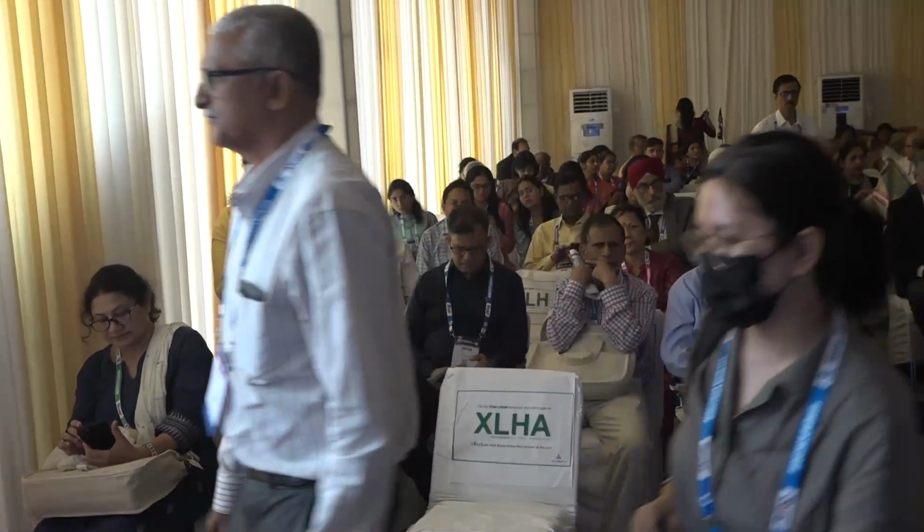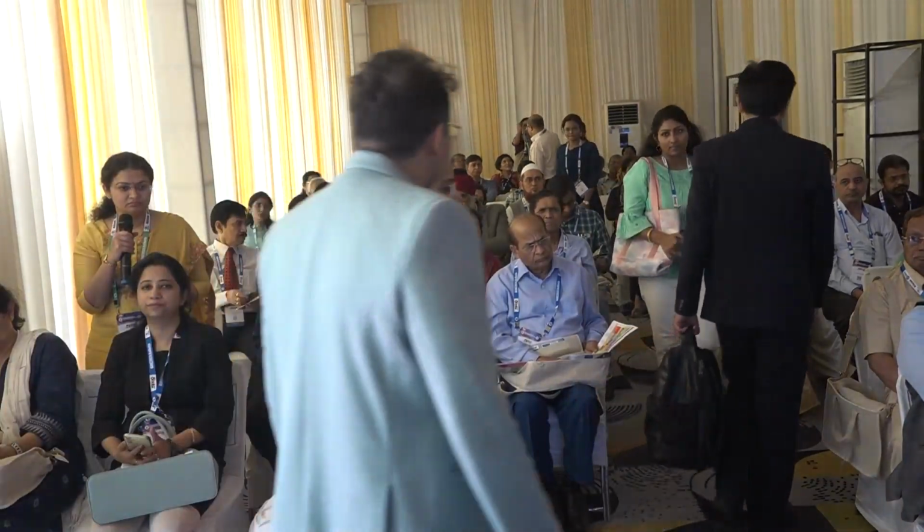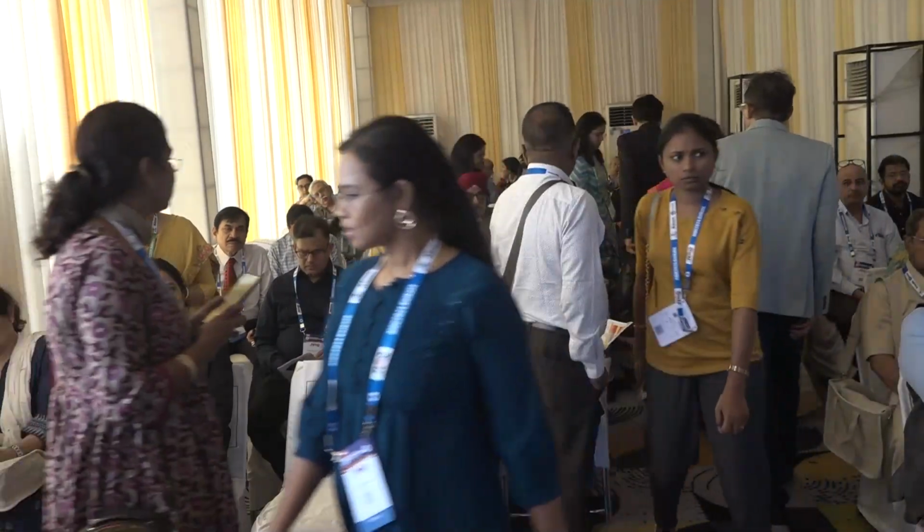Good morning, sir. So in case of a tilted disc, how to assess the RNFL in these patients? Madam, in a patient with a tilted disc, how good is an RNFL? It isn't, because we don't have tilted disc normative data. So that's why it becomes very difficult. In fact, tilted disc is one thing that for glaucoma people, whether you're doing a field or you're doing an OCT, becomes very difficult. So there are other methods by means of, let's say, diurnal variation, continuous follow-up, create a baseline for this patient and see whether there's progression or not. That's the way to go about it.